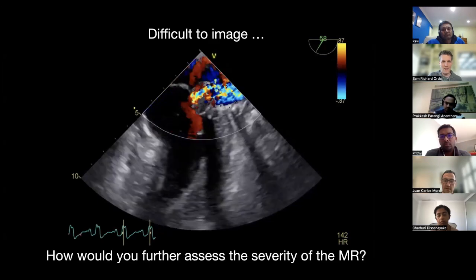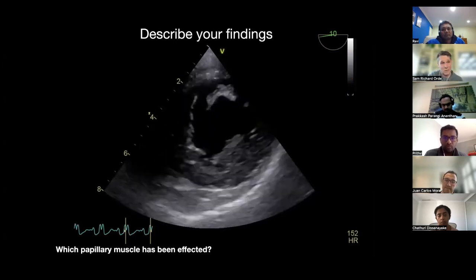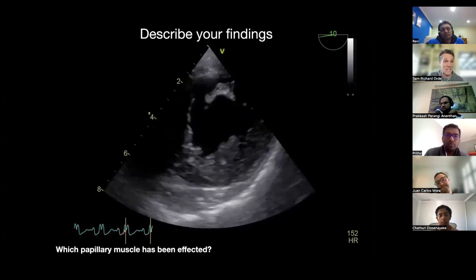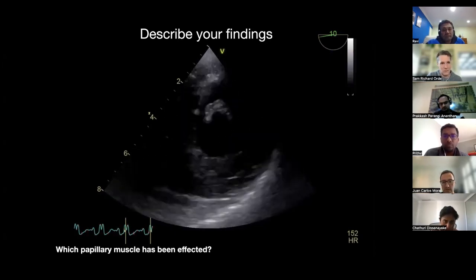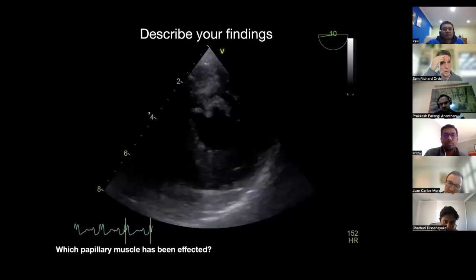But on this one, you can see regional wall motion abnormalities. And again, you didn't tell me. You told me you thought it was anterolateral, which I completely agree. And then what I'd love to have heard was, because I can see there's probably some hypokinesis. It could be akinetic if it was able to be slowed down. The tachycardia gets in the way, obviously. But it appears that the anterolateral wall is hypokinetic, in keeping with the LAD territory, circ territory, and function. So again, just a few easy marks that would have been the difference between a pass and a pass well.